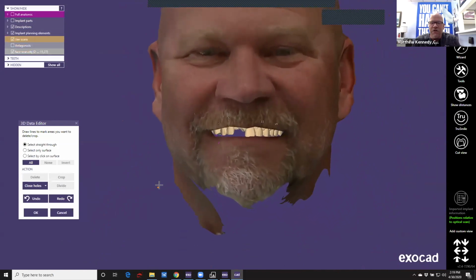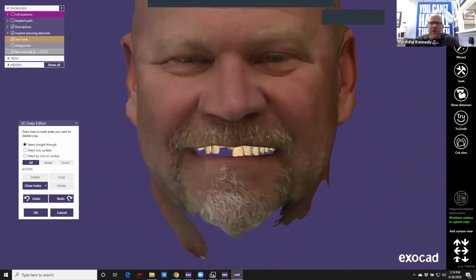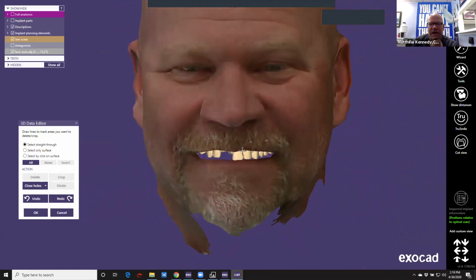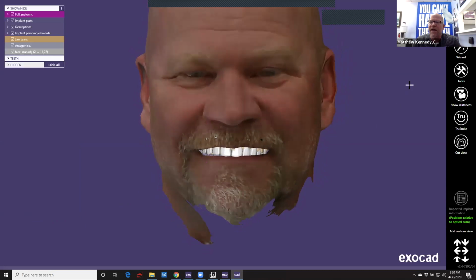his mug. So again, talking about bone augmentation, when you see the smile here, you can still see the tissue. We know that if this patient, myself, were a full arch candidate, we would definitely have to remove a lot of this bone in order for the transition line not to show when the patient smiles real big. So knowing that, let's do this. Let's go ahead and get rid of my big old head.